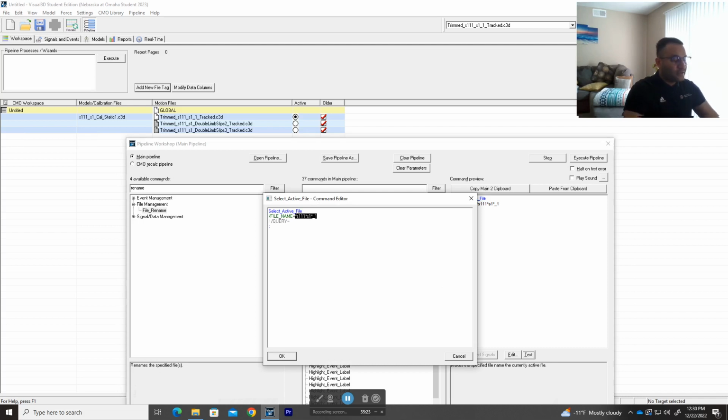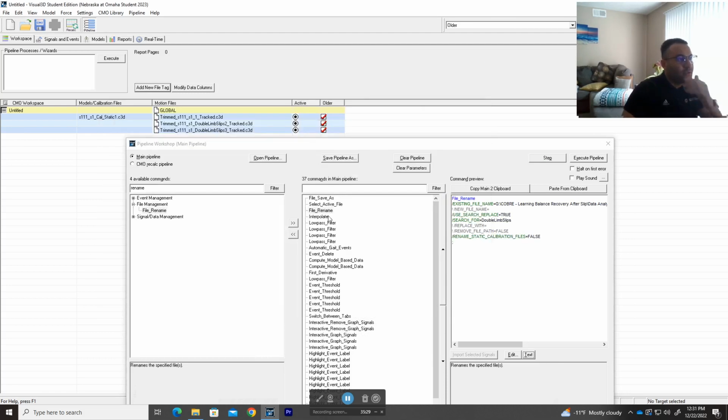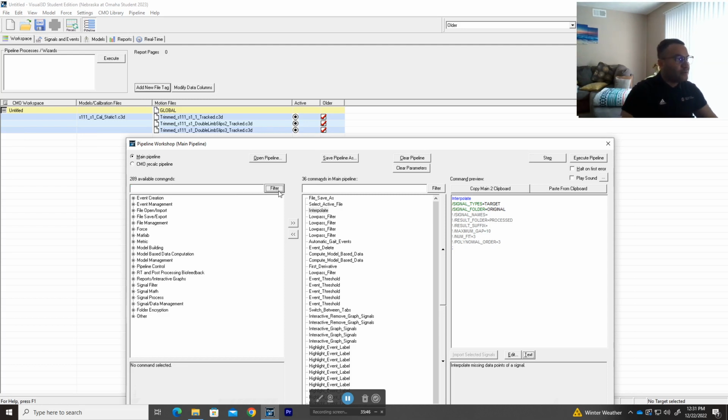All right, so here I'm just going to go back and add older step, and then we'll have older. I'm just going to move this back here, we don't need it, but it's also a very powerful tool. Like I mentioned earlier in one of the videos, you cannot delete any data, but you can rename it. So it's a good tool to be able to rename your data.